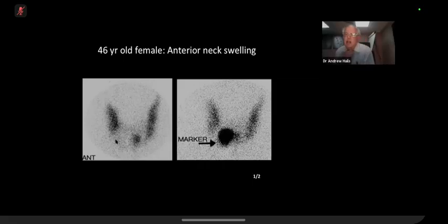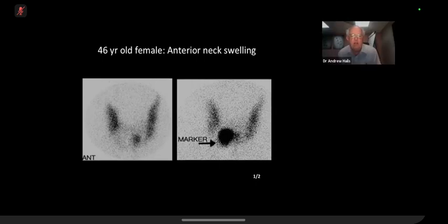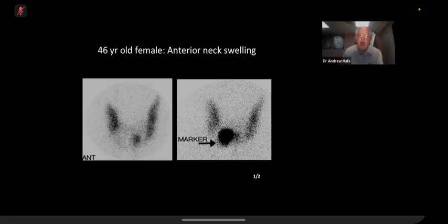Well, the thyroid gland lies at the front of your neck, doesn't it? So the gamma camera will be in front of you for a thyroid scan. So for a thyroid scan, this would be the right side. Admittedly, it might say right and left and so on, but in all thyroid scans, this would be the right side. So photopenic area, what's that likely to be? It could be a cold nodule? Yes, good. Someone has palpated the person's neck and found a lump, and they've put a marker there just to show where the patient's lump is. So yes, it's a cold nodule.